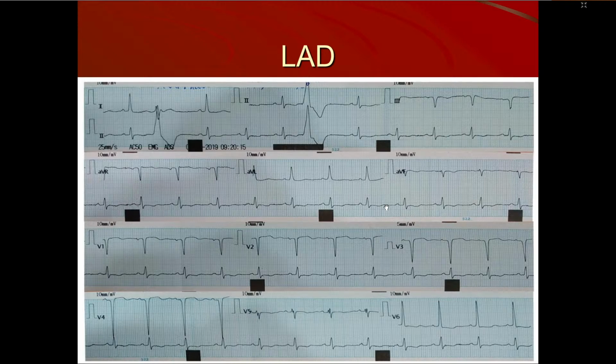Now, in lead 1, positive. Axis, the current is going towards lead 1, towards 0 degree. Axis is around there, 0 degree. Now what do you expect in lead 3? It is going away from lead 3. That is why it will go towards lead 1. So lead 3 should show an S wave. Then you see in AVF, it is an S wave.